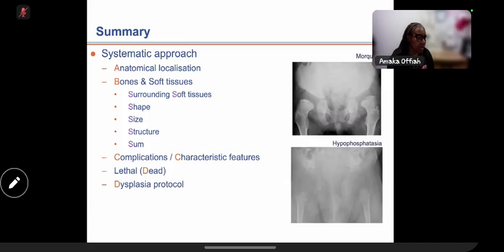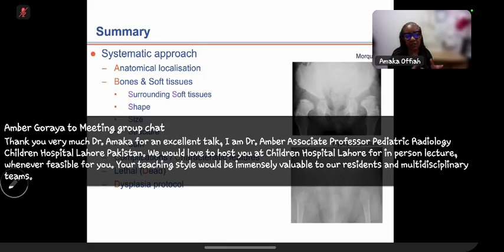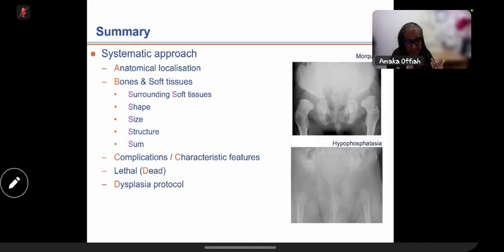And we touched upon lots of characteristic features that we might see, the exostoses, for example, and remembering that a characteristic feature might be absence, the absent clavicles in cleidocranial, for example. And then we looked at how conditions in the same group might be lethal or non-lethal, which is what the other D was for. And here I'm showing you Morquio again, and then just a radiograph of hypophosphatasia. Don't miss that diagnosis because we can keep that child alive through enzyme replacement therapy.